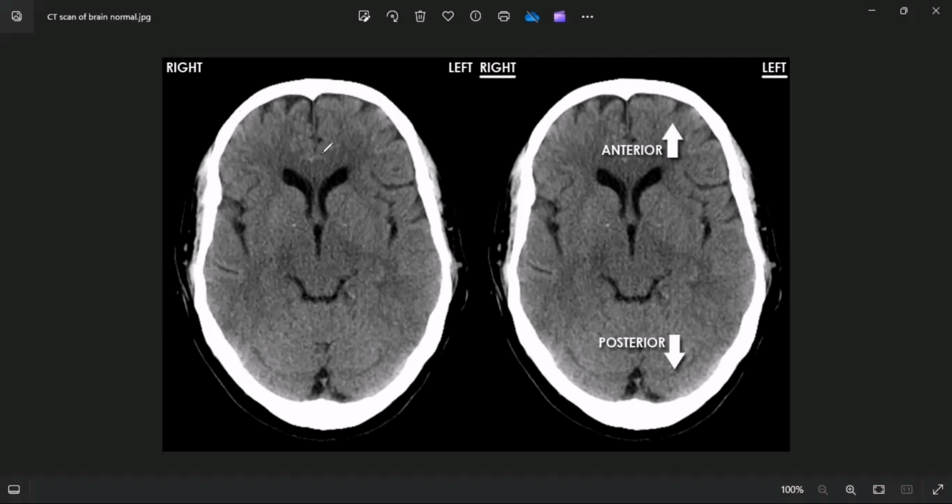I want you to take a close look at the periphery. Look at this. Look at the periphery, then look at the center. What can you tell me about them? Do you see that at the periphery there is a whitish line like that? Look at this place too, a whitish line that goes like this. But when it comes to the center, it is dark. Can you see that?